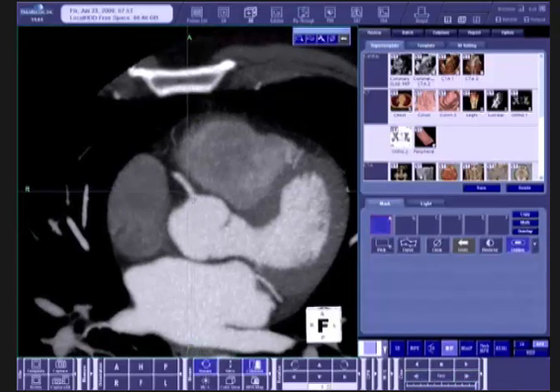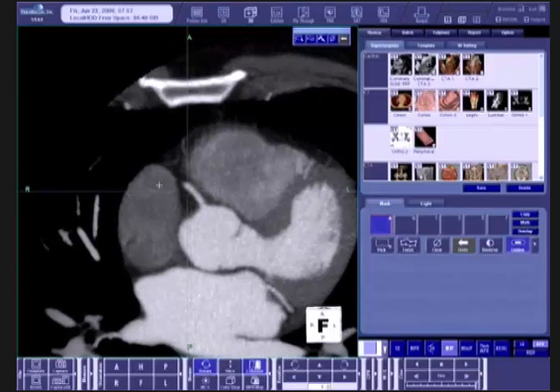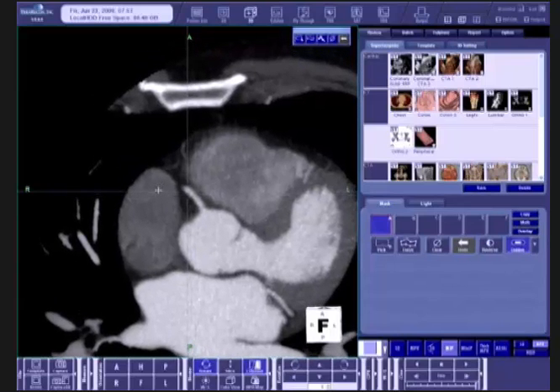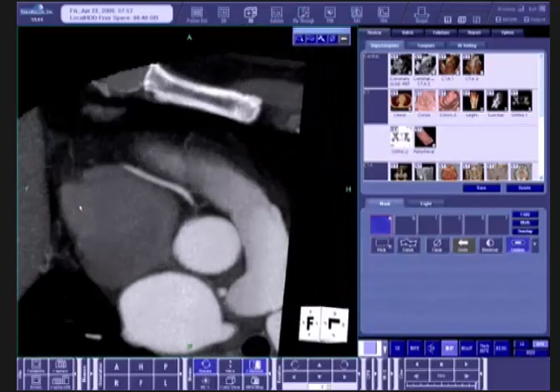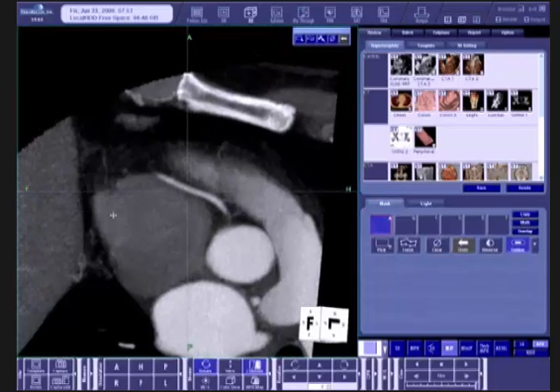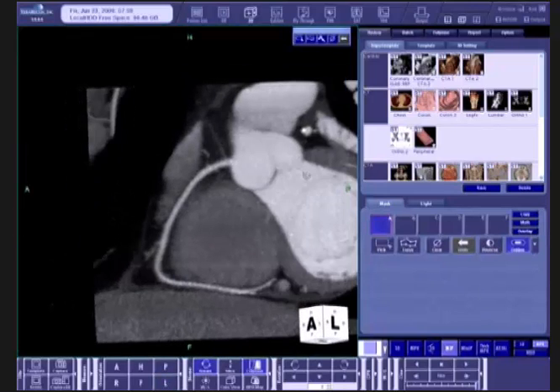I've got a relatively motion-free image here, proximal coronary artery, and I'll navigate again in that direction, bringing the right coronary into view. There also was one view that seems to work out very nicely, that's very nice for display, and I'll go to the proximal portion of the coronary, hit the lateral button, and then do a manipulation which involves moving the mouse to the right and down somewhat.